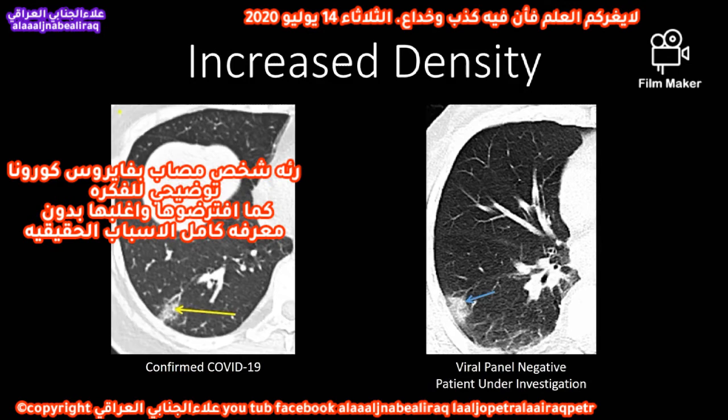In addition to traditional ground glass opacities with a rounded morphology, at times people are reporting with COVID-19 and other viral pneumonias a more dense, round opacity. This is progressing from ground glass opacification really to more of a focal consolidation. You can see it remains peripheral and poorly defined.